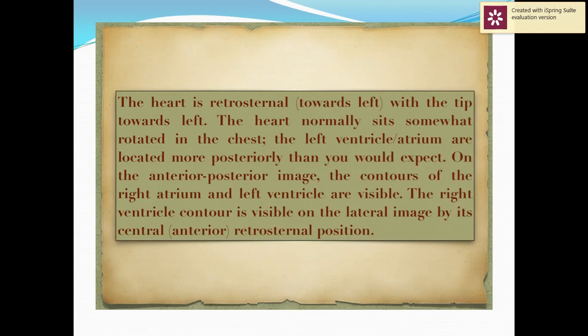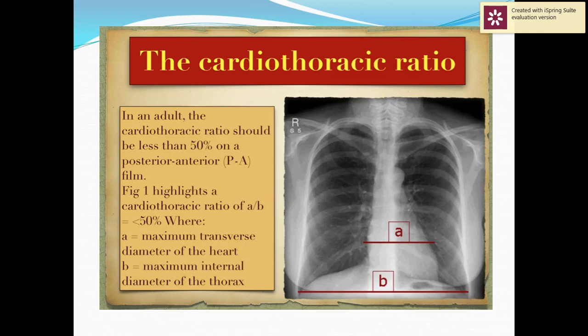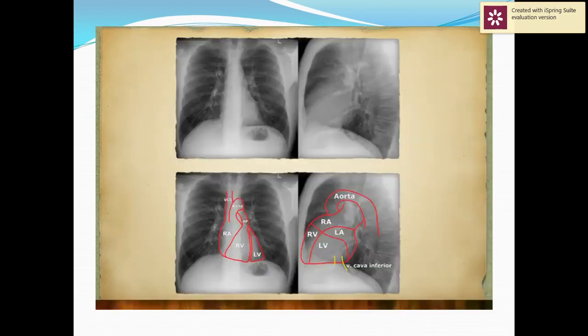Very important ominous sign to differentiate, in cases of ARDS, cardiogenic from non-cardiogenic pulmonary edema. An important clue sign also to differentiate, one of the important questions during the exam.